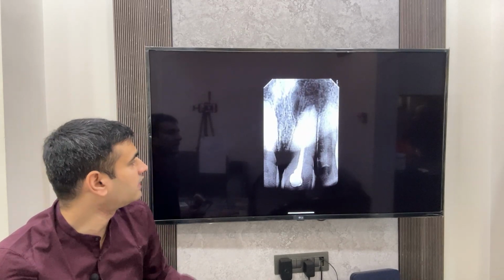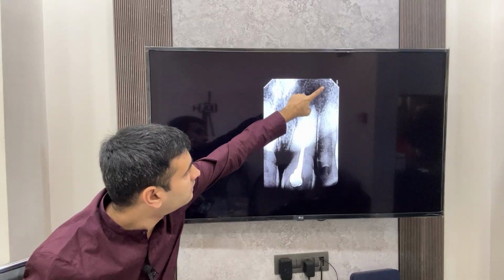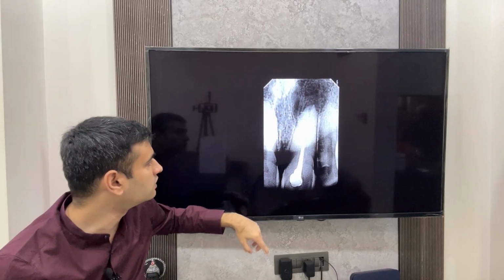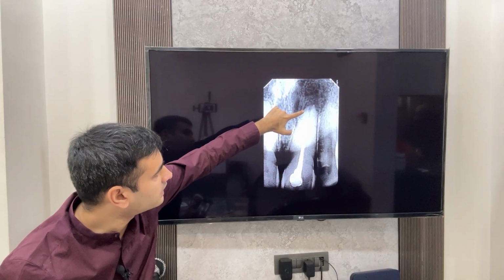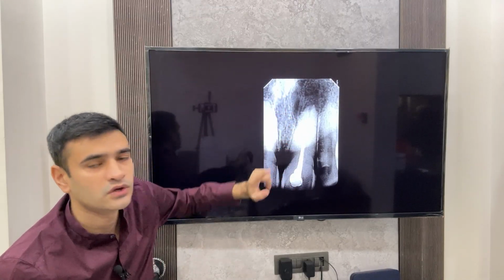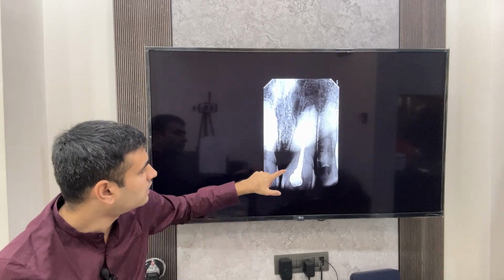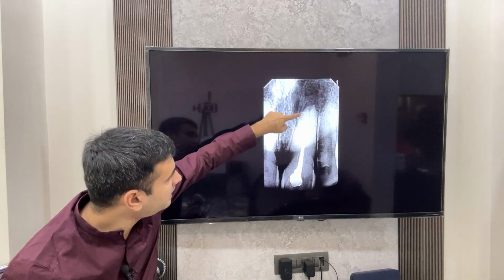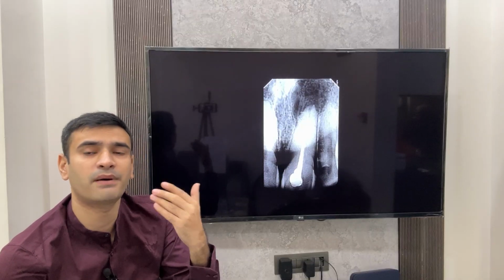Let me show you another x-ray. This is a central incisor that has a large radiolucency beneath the tooth, and the dentist has tried to go to the full working length, but still there is a good amount of bacteria inside the canal. So what has happened here is that the dentist sometimes might go till almost the full working length, but there might still be apical pathology.